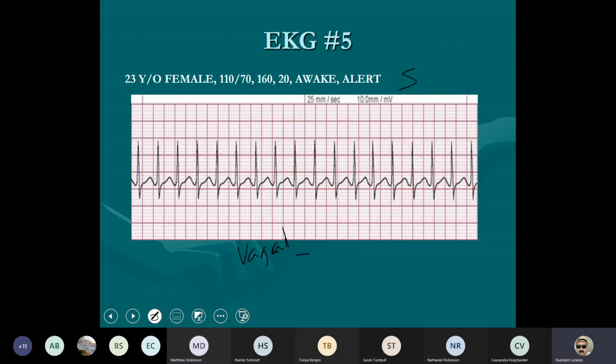Okay, why isn't it sinus tach? Because the P waves and T waves are combined, so you can't quite make them out. Okay, first treatment's vagal maneuver. Second treatment, she's stable. So since she's stable, we can do something for fast heart rate. So I'm going to do adenosine. First dose is 6. Second, 12.